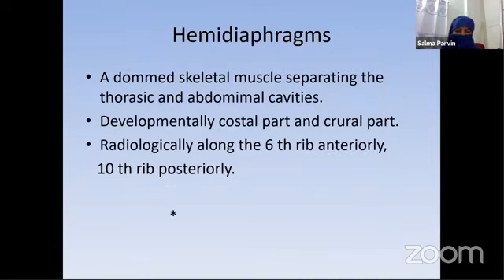So this is most of what I hoped to cover about what you need to display on the X-ray plate and how to read a normal chest X-ray. I have presented these things to you in a simple way. Later on, if you want to continue, I think today is enough load. Go through and memorize all those things, and later we will go through other normal things in normal chest radiography. Do you have any questions I can answer?